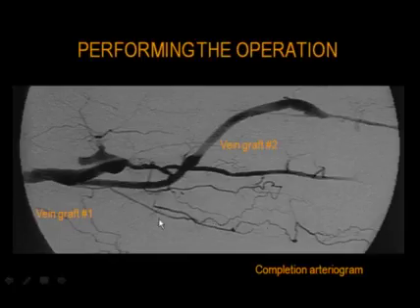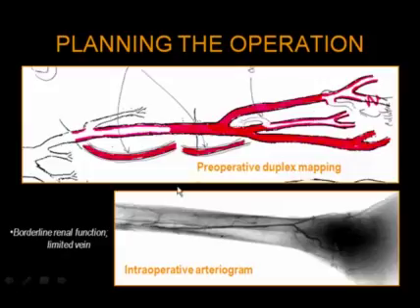This patient went on to get 2 vein grafts, an interposition vein graft for repair of the popliteal artery, and a distal vein graft down to the distal anterior tibial artery for repair of those issues, and with a very nice result. And again, this shows the power of the duplex scan in this setting in patients who are contraindicated for large contrast loads.